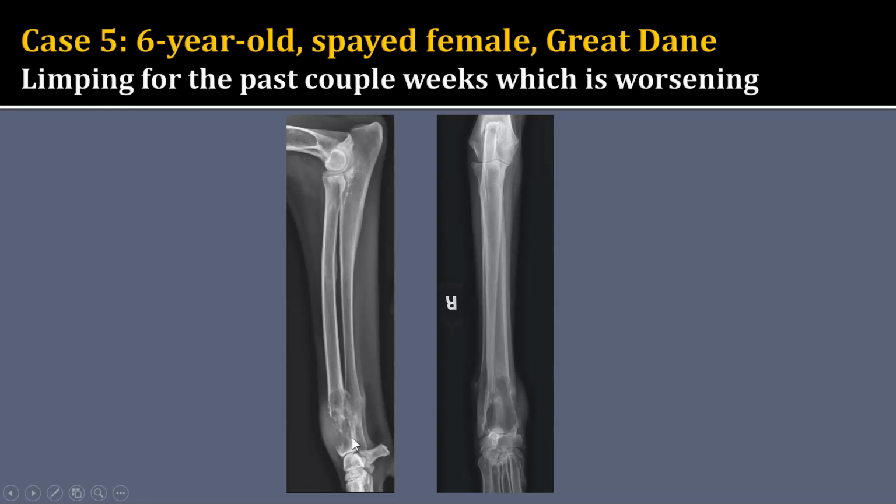This seems to kind of expand the bone. Notice that the bone looks a little bit wider. There is a little bit of probably spiculated periosteal reaction, maybe even a little bit of amorphous periosteal reaction. And this lesion is only involving the distal radius. Notice the lesion also is indistinctly marginated, so it has a poor transition zone.